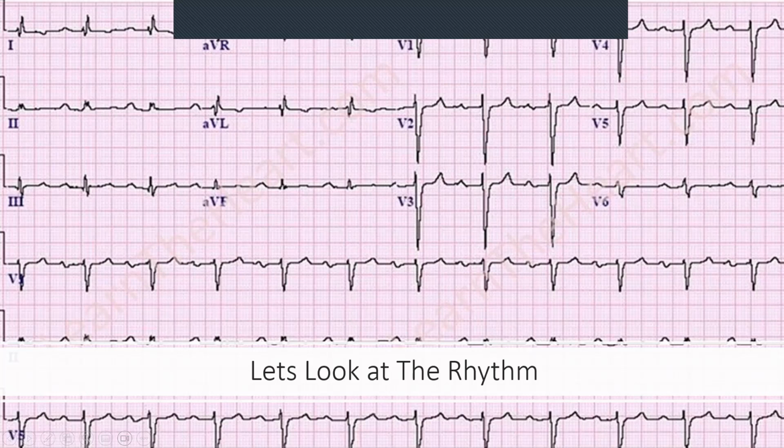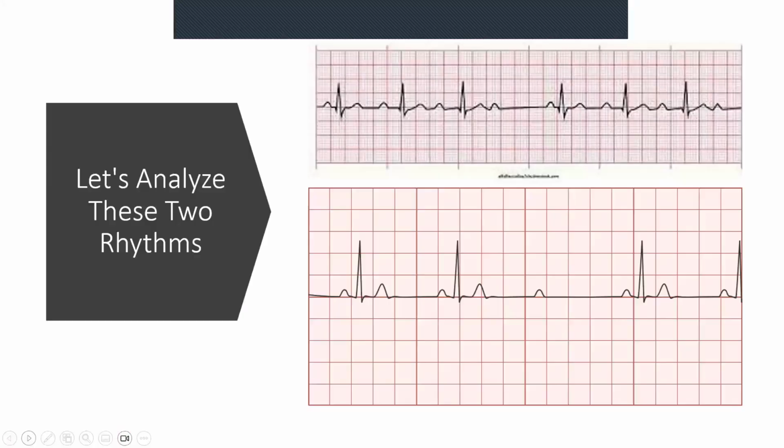Is this patient at risk of something else going wrong? Yes. So this patient at some point needs to be seen by a physician, cardiologist, things like that. A lot of the times this is just an incidental finding, unless there's symptoms. If there's symptoms, then we do get worried. Okay, let's look at another one.